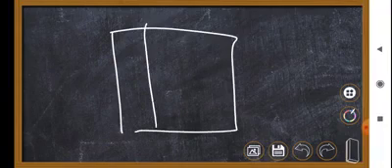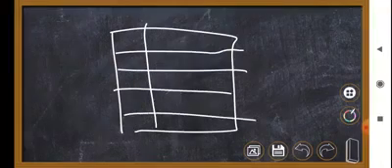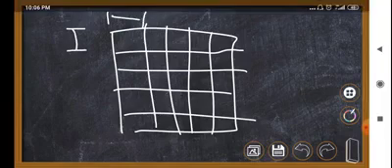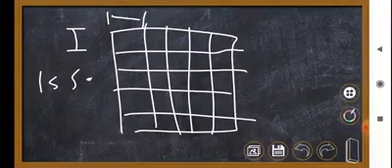Additionally, one thing I want to clear: suppose again these are small scales and large scale, both from the horizontal and vertical side, one small scale is equal to 1 millimeter.